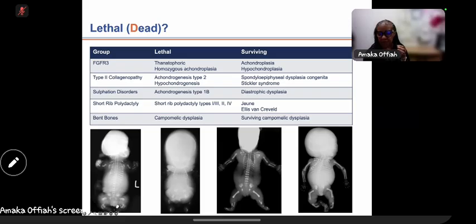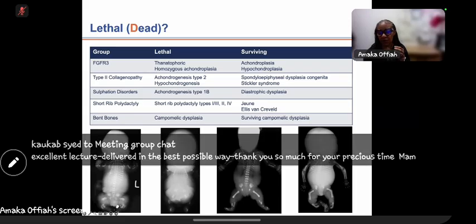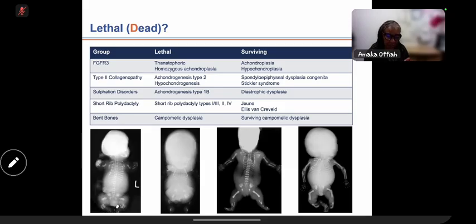Look for the absence of the scapular blades. All you may sometimes see is the spine of the scapula, as in this example, and very hypoplastic or very small scapular wings. There are other features, but if you don't see a scapular wing and you see very subtle bowing in the femur and tibia, campomelic dysplasia, you can then start looking for the other features.